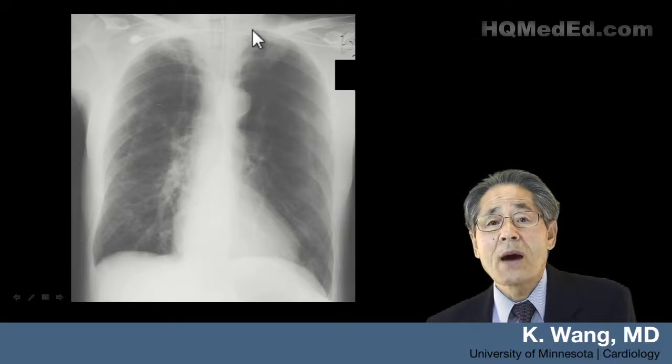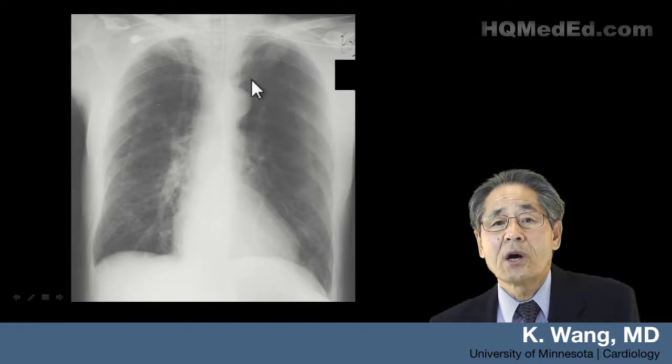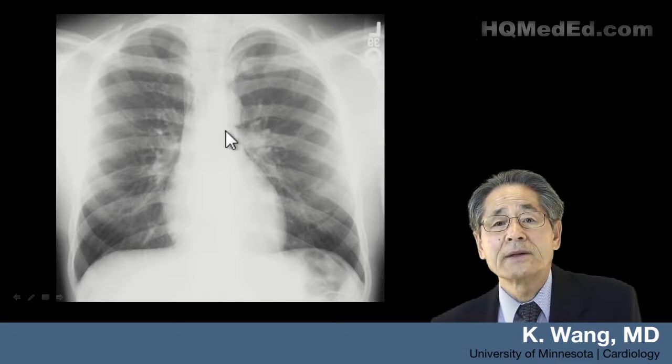Why no lung markings here? This patient must have a bullous emphysema affecting more of the left upper lung. Can you make the diagnosis? And a very important one too. The finding is here.